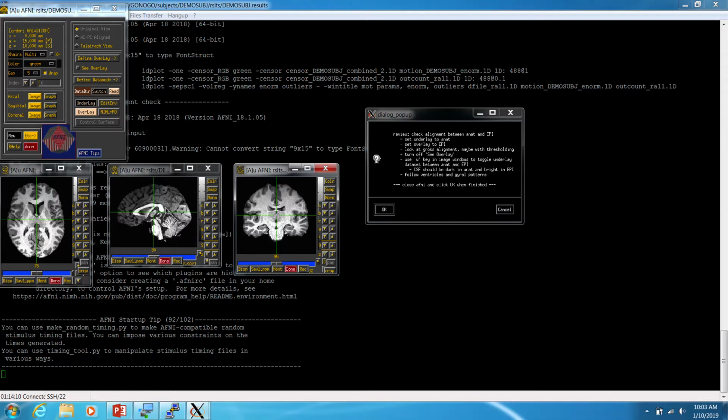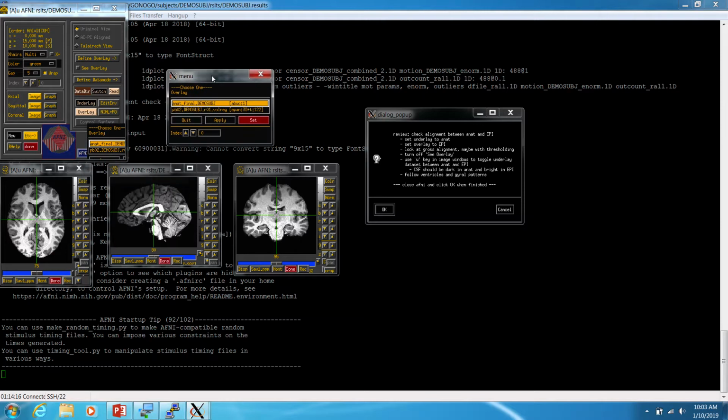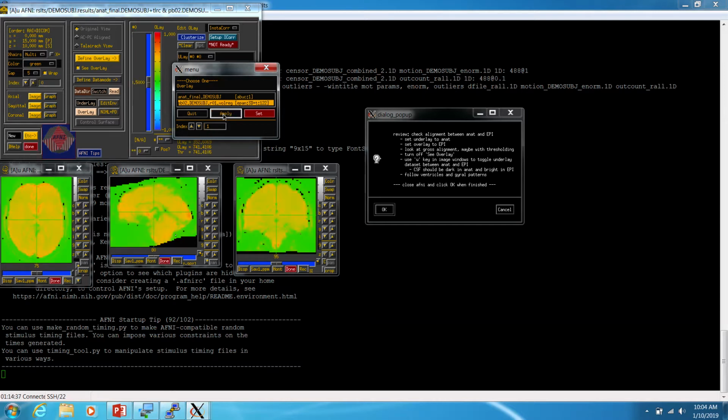This is the underlying anatomy. And so then we're going to go in and set this overlay. This isn't an actual file exactly. It's a space that's set up so that we can just look at this data quality. So it ends up using the second step, the volume registration here that we looked at a little bit earlier. So this is the volume.